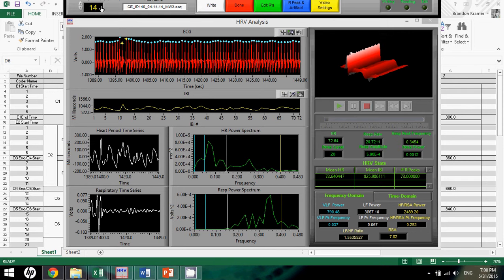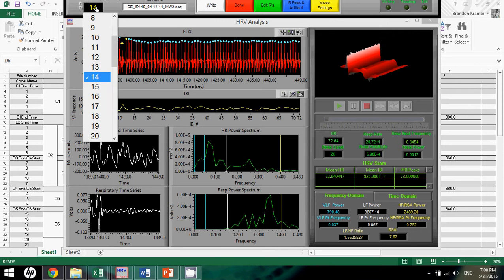These are segments that are just too complex for a research assistant without the necessary training and experience to diagnose. In those circumstances, you'll simply want to mark that the segment's questionable so that somebody with more experience can come back and interpret that data a little bit later. So we'll take a look, and I believe it's 36 that shows this process.